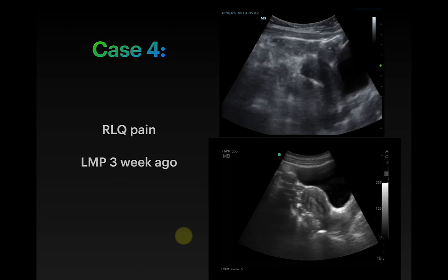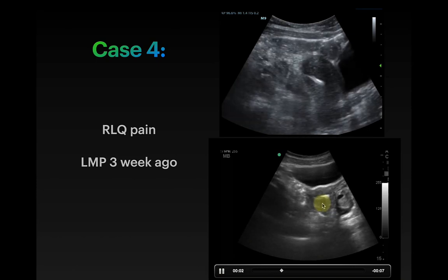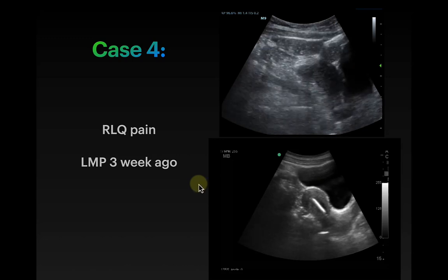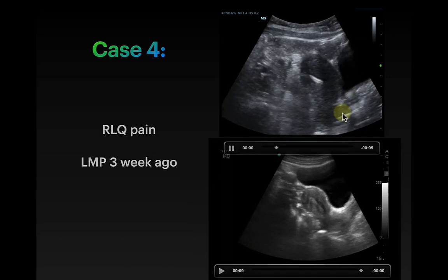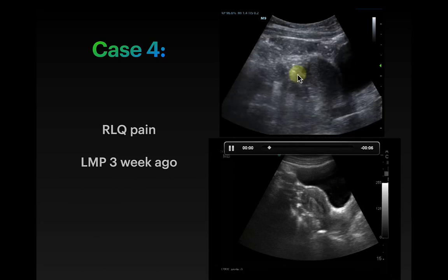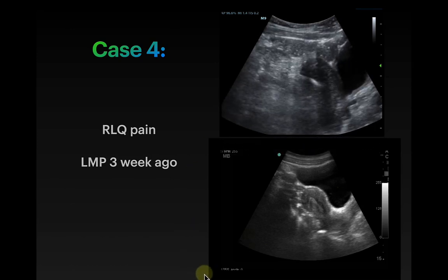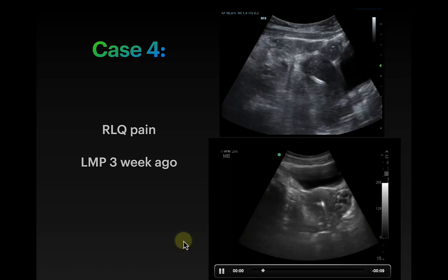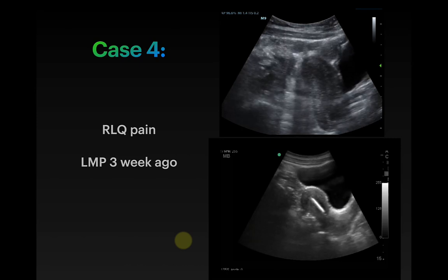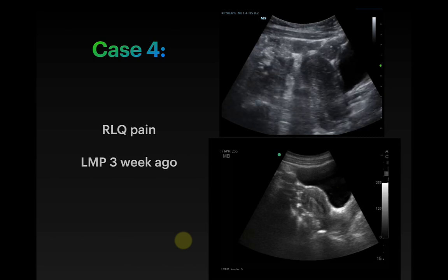It is an IUD. If you were an IUD, would you prefer to be in the top picture or in the bottom picture? I think the patient would agree with you. So this top one is a perforated IUD. It's actually not unusual for these to start to move out of where they belong. Typically, we start searching for them with a KUB to see, is it actually in the pelvis? Is it in weird spots? Sometimes it's hard to see them on ultrasound, and so they could be in the uterus, but you just can't see them very well. But if you do happen to run across an IUD that's deciding to leave the uterus, this is one example of what it might look like.